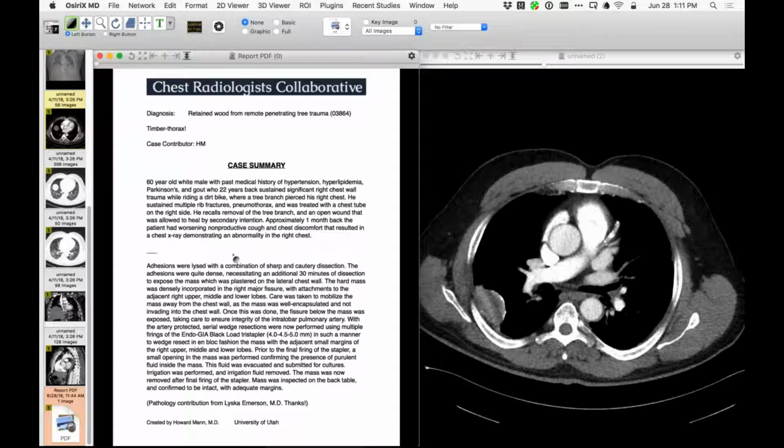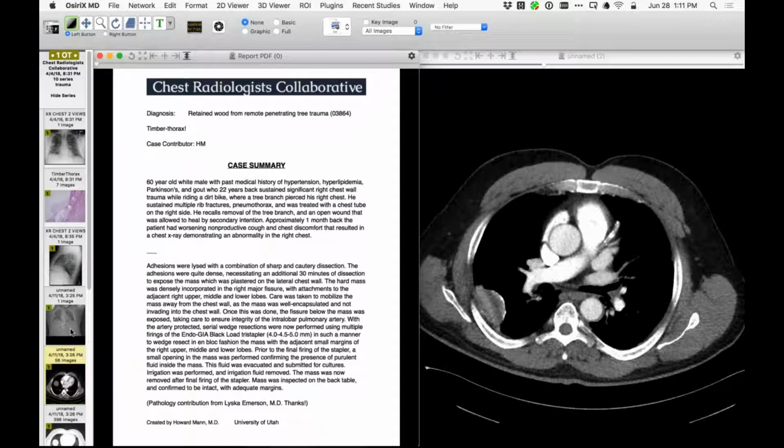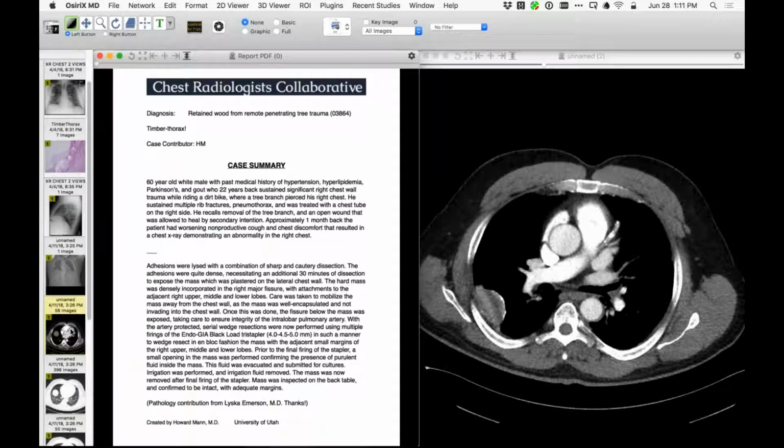There's a lot of tissue to this thing. It's interesting that when they saw it, there was some fluid within it. So that cavity part was partly fluid and partly pieces of wood. It looks like it may have been chronically infected based on the description from the surgeon that you're showing. Yeah, or it's certainly inflamed.